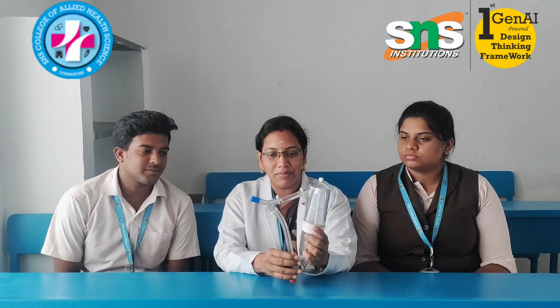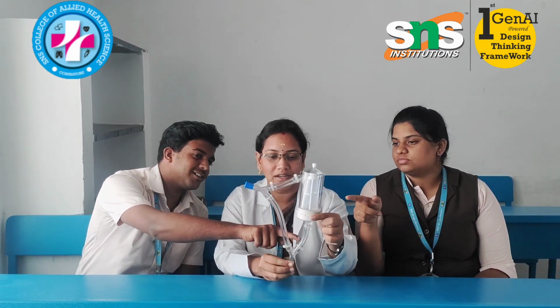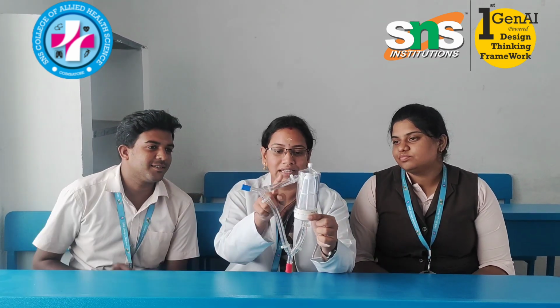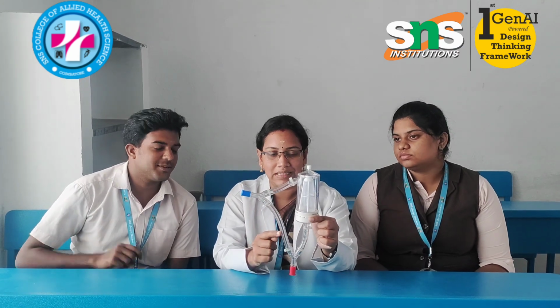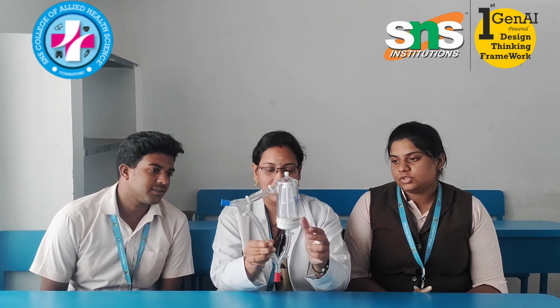This bubble trap has different parts. Can you name the parts? Inlet, outlet, bypass. Very good. It has an inlet, an outlet and a bypass line. The inlet is coming from the oxygenator. Where is the outlet going? To the patient side, so it is going to the arterial line.